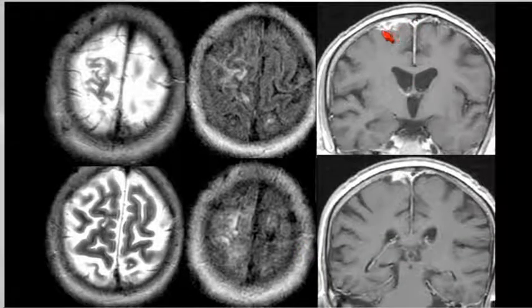And here we also have some superficial enhancement of the leptomeninges with a filling defect. And remember, you may have cortical vein thrombosis as a secondary complication, which can lead to ischemic changes in the brain. So combinations of unusual regional ischemia, arterial or venous, should also bring to mind the possibility of a local infection causing that ischemic change.